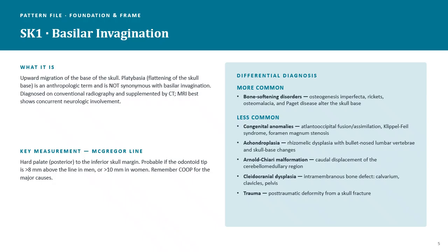All right, so one thing we don't want to confuse this with is platybasia. Platybasia means that the skull base is flatter than normal. Basilar invagination means that there's an actual upward displacement. So again, this is your basilar invagination.